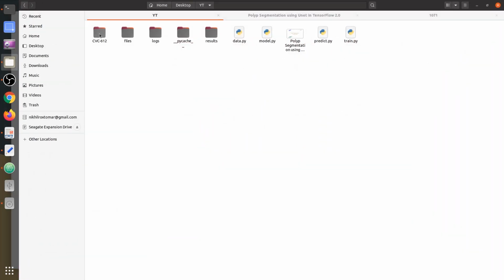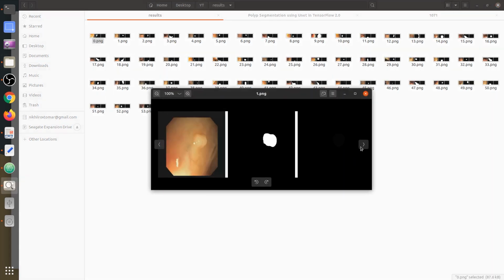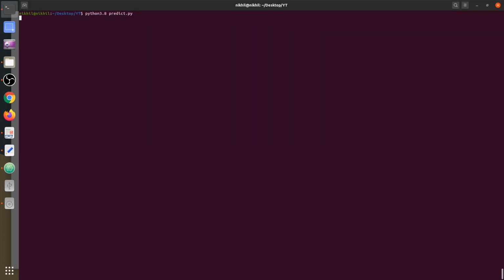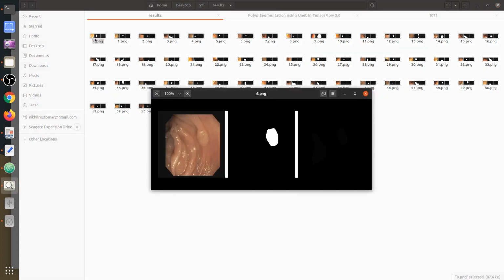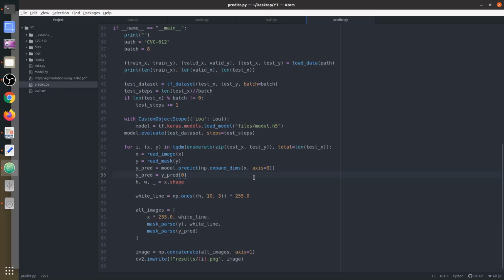So this is the results folder. Okay, let's do one thing. Let's remove this threshold value and see the value of the original mask. I think I applied a much greater threshold. So threshold should also be applied accordingly. Or maybe there's an error here. Let me just check if there's any problem. I think there's some problem here in the code, why it's not working correctly.